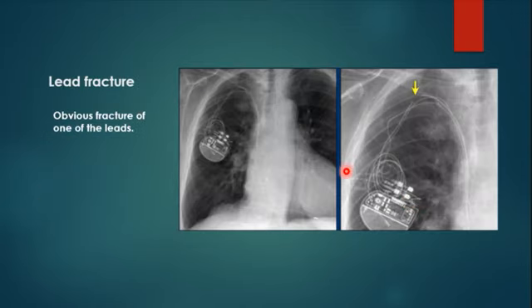Also, one of the common problems is lead fracture. The leads or the wires can sometimes be fractured, causing malfunction. So it is very important on X-ray to look carefully at each wire for any filling defect. I hope it's clear here. You can see it is not continuous.